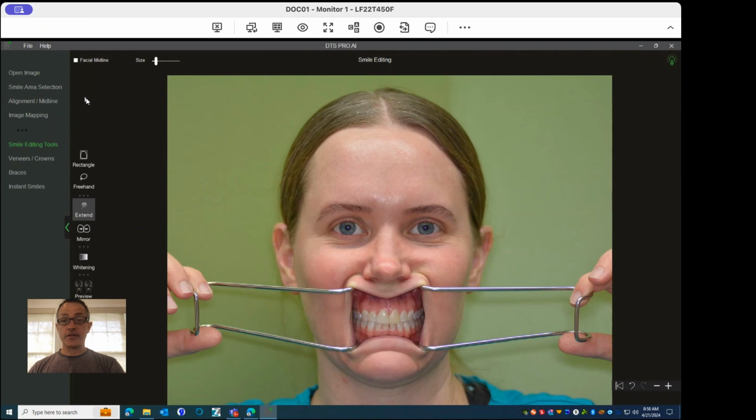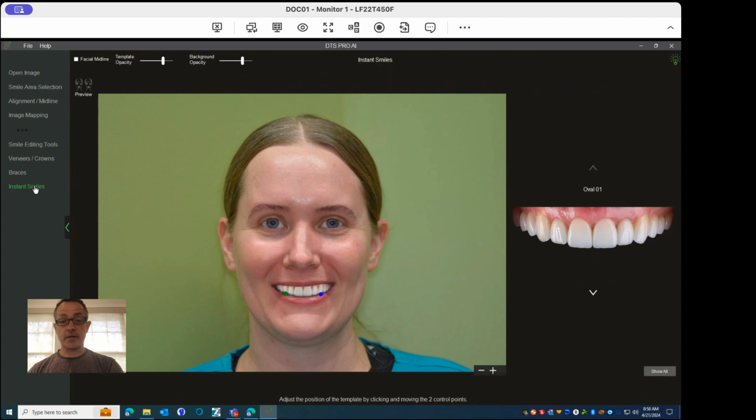Now, if you're my patient, I'm going to skip over the smile editing tool and go straight to instant smile. And you can see what an amazing, outstanding job it did of just importing a really beautiful smile right onto someone's face. And it's pretty true to life as to what kind of results we're looking for, because we've already pre-chosen our custom template, and we can obviously change all these different size teeth. I'm not going to because this is my favorite, it's my go-to, so we're going to leave it as is.